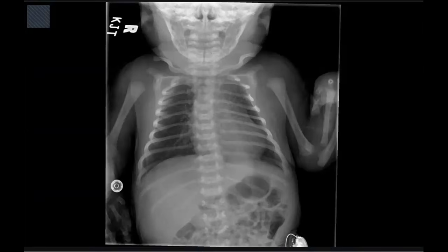One day old patient with no available history. I'm presented with a frontal radiograph of the chest and the upper abdomen for a neonate, which I would like to check first. There is no available history, and I can appreciate that there is an ill-defined area of.